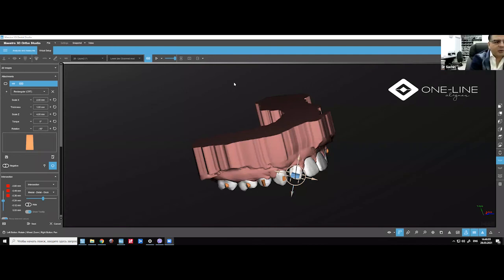And I just want to show you, can you play that automatically? No, will the tooth move distally as well? Attachment on one tooth will move the tooth distally as well. Only if you plan it. As I said, you cannot move mesial tip and distal movement. It's not correct. So you understand the question now. You want to move the tooth distally, but the crown mesially. You're going two different directions. Not correct. So you can move distal and distal, yes.